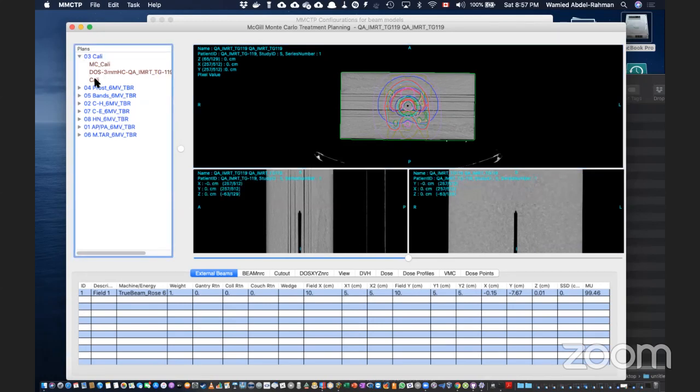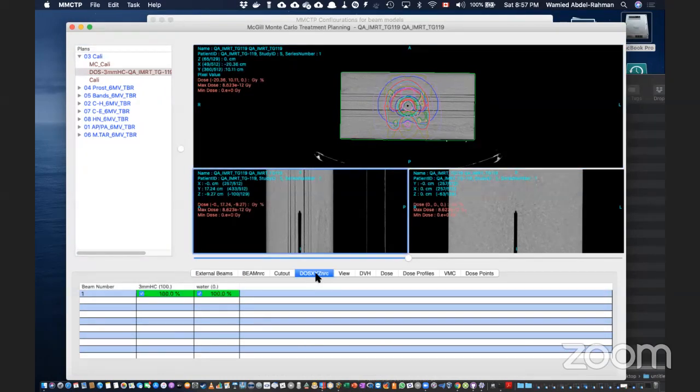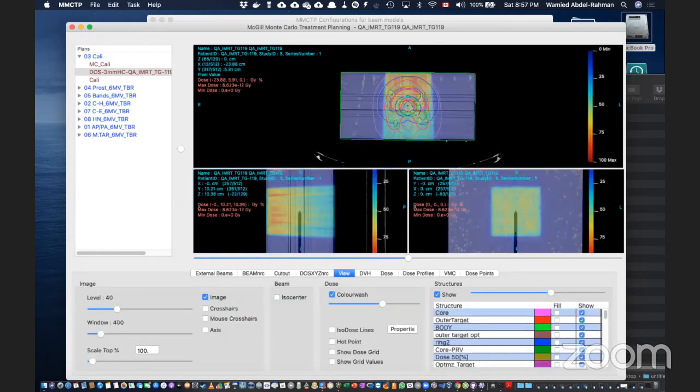So this is what I'm struggling with, just to show you. That's the file calibration from Eclipse. Then this is the simulation. It was a dirty simulation, just a small one. This is the one that I've done with a very long run. I think this was 8 hours, because I went for 0.5% uncertainty. So I took that value, and this is water.